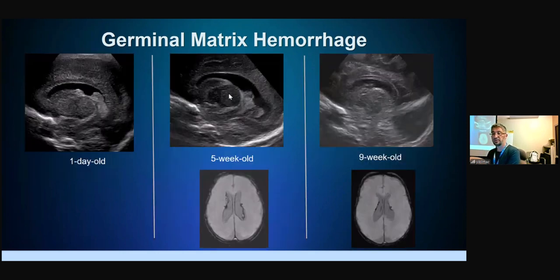Here, the choroid plexus can be slightly bulky. It can have a hump, but it's never like this. This is very irregular, very heterogeneous. Some parts are very hypoechoic. And so this is actually hemorrhage, not a normal choroid plexus. And this is the confirmation with MRI.